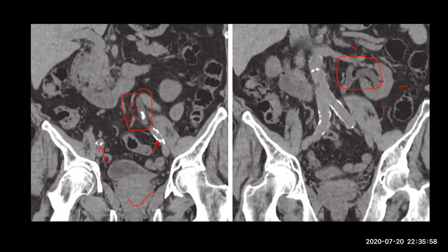The patient has a stone in the left ureter causing hydronephrosis. And this is the external iliac artery. This is the common iliac, external iliac, and the aorta has some atherosclerotic changes. Also the prostate is relatively enlarged, with some osteoarthritic changes of both hips.